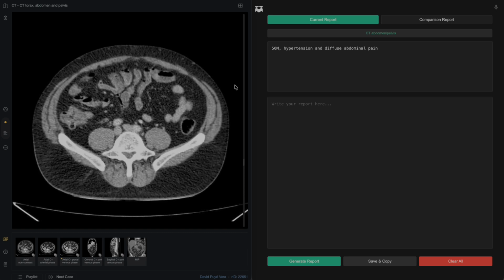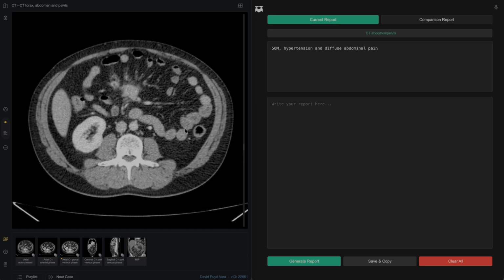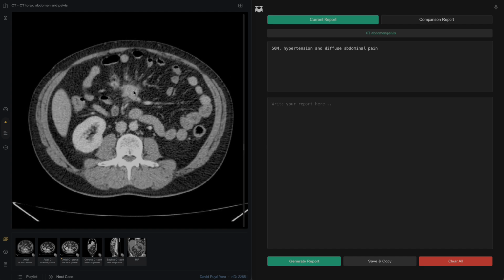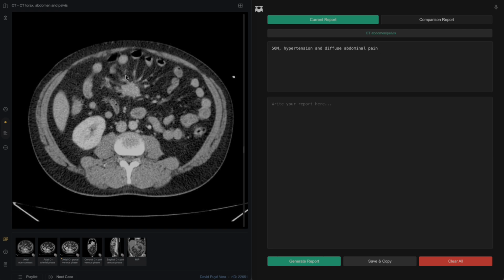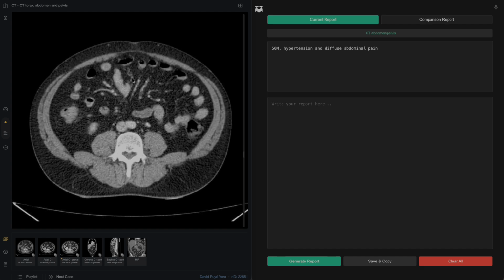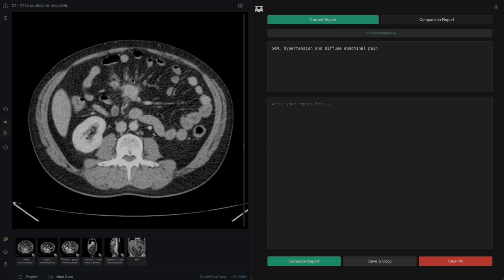And you might have noticed in the centre of the abdomen, based within the mesentery, there is this quite irregularly shaped mass, really at the root of some of these small bowel mesenteric loops, and we can see this soft tissue extending up the vessels into each of these leaflets of mesentery here. You get the impression along these vessels as they fan out, suggesting a degree of surrounding desmoplastic reaction. It looks like this mass is enhancing.